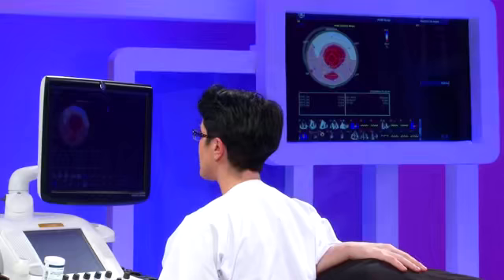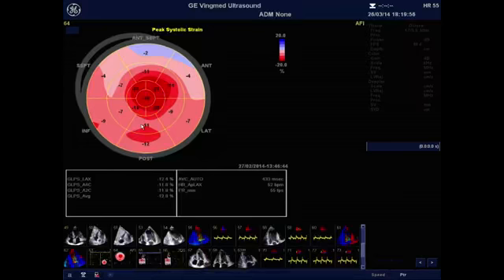which was recently proven to be highly sensitive and specific for cardiac amyloidosis when needing to differentiate it from control patients, while all the other segments have abnormal longitudinal deformation in systole.